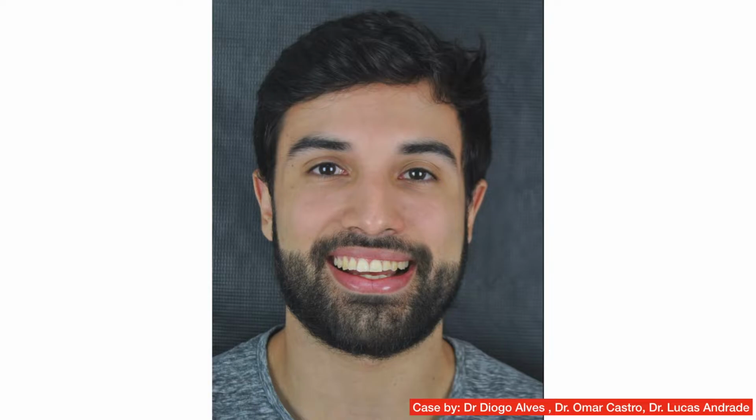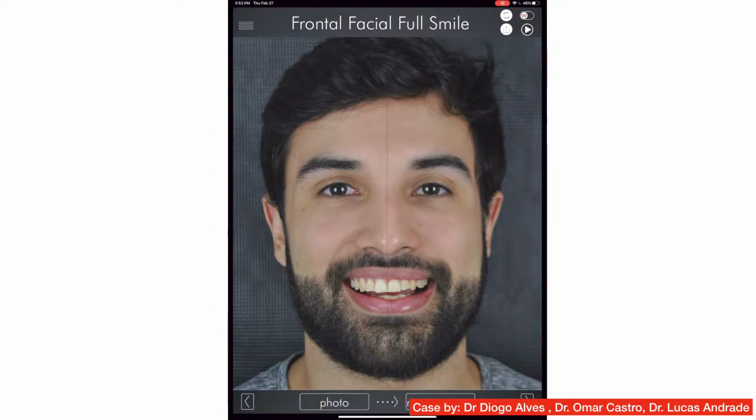So as the patient was talking to us, we mentioned the DSDapp, which is this tool that helps doctors and patients visualize their potential new smile by using facial analysis and digital smile design. He was interested, so we took a frontal facial smile picture of the patient to simulate a facially driven motivational smile using DSDapp. In this way, the patient could also participate in the smile design process and give us an idea of what exactly he wants for his smile, what is beautiful for him, according to him.